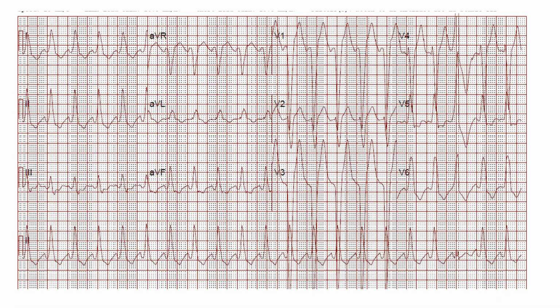Why is left bundle branch block confusing? Left bundle branch block normally intrinsically will cause opposite ST changes. So if you have an upright QRS in lead 1, you will have opposite ST changes in lead 1 and AVL and 2 and all the leads with an upright QRS. You have a negative QRS in the precordial leads V1 through V3. You will have opposite upright ST elevation in those leads, okay? So inherently, it could be confusing when you have STEMI and left bundle branch block. Is this ST elevation secondary to left bundle or is it ischemia?